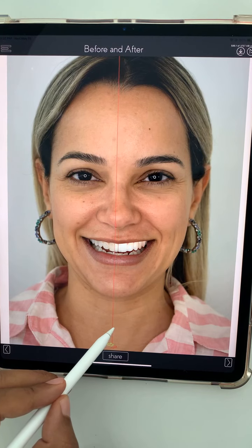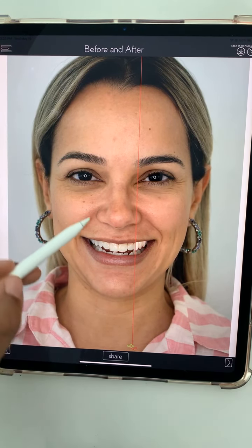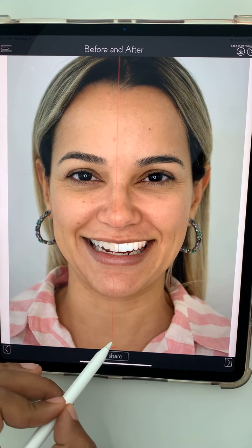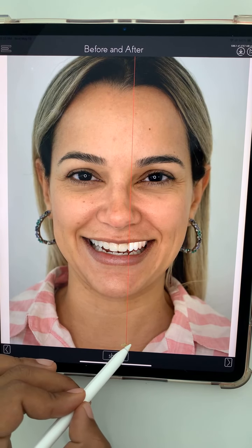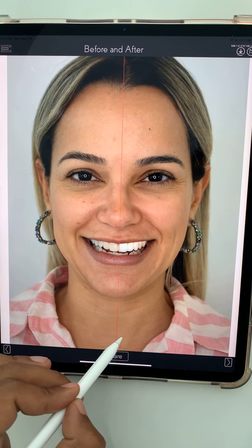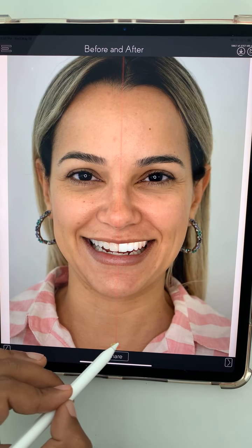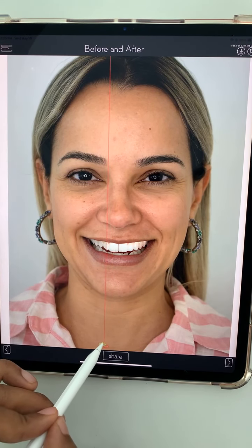Okay, so in this case, this patient, we will see her in August, but we are already planning her case. As she's going down to Brazil, we're gonna do her case in our office. But here, as you guys can see, we will increase the laterals, which is her main concern. We will also change the shape of her centrals. You see, she already has some sort of square-like centrals. We will keep that shape, but we will just harmonize it so they look more like the same. We will also work on her canine.